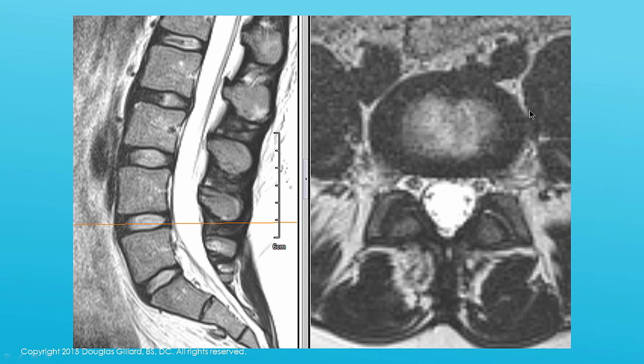This is an overhead view. It's really from underneath view. So who cares about that? That means that the sides are reversed if we're looking from underneath. So this is really the right side. This is the left side. And again, I'm not testing you on this. This is just for your own information.